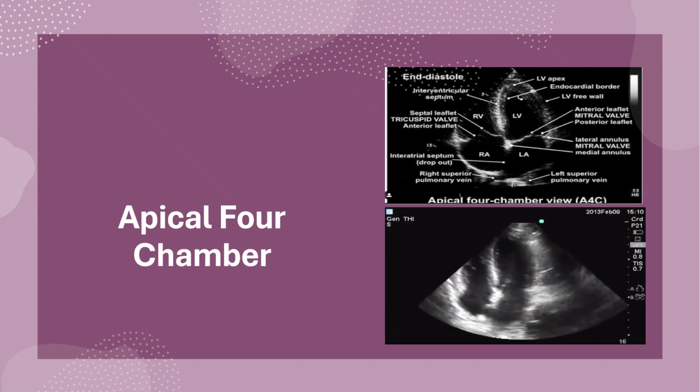In this particular view, you want to assess the size and function of the chambers. You're going to look for any gross pathology of the mitral valve and tricuspid valve, and also assess for any present pericardial effusion. Please pause the video if you need more time to understand the slide.